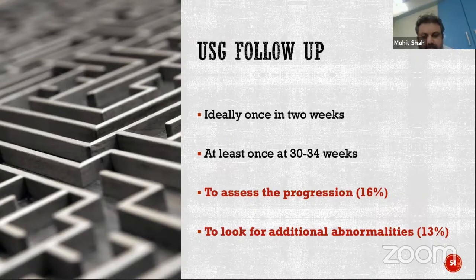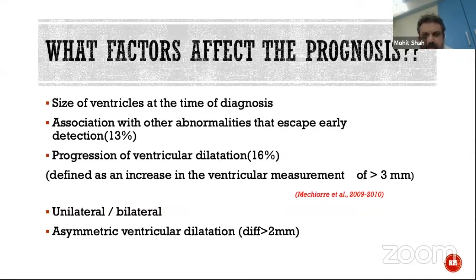Now in the transventricular plane, fortunately, you can see the cavum septum, you can see the lateral fissure as well as the ventricles. So you can exclude all midline abnormalities, but what we cannot be very sure about at 20 or 26 weeks is gyrational abnormalities. So sulcation and gyrational abnormalities is what we should look for every time the patient comes for a follow-up. Initially, in 2 weeks, if we don't see the ventricles enlarging, we're still looking for sulcations and gyrations, and then subsequently we can schedule it about 3 to 4 weeks, again looking out for sulcation and gyrations.